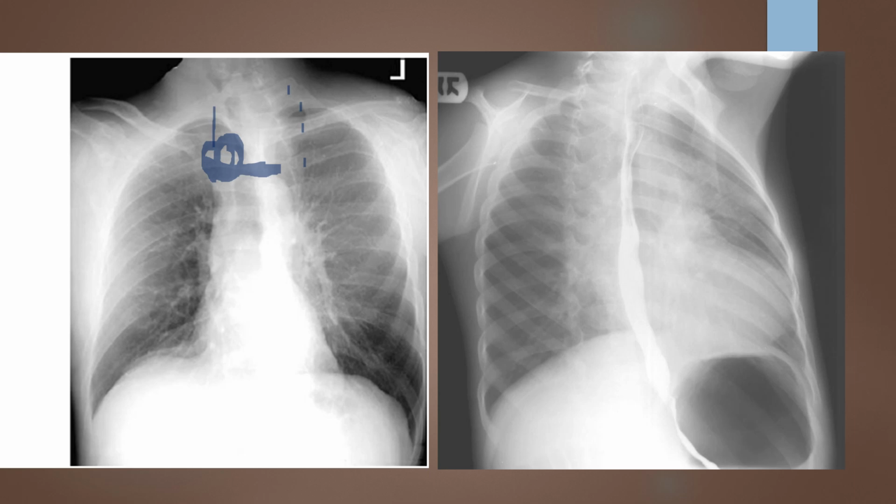Over here on this patient, just eyeballing it, it looks like they did a much better job. If this is not ribs, but it's truly an oblique chest, I see apex to costophrenic to apex, all the anatomy is there. That's checked off. Secondarily, now I'm going to go through my technique. So I'm looking for soft tissue detail, bony trabecular pattern, and good cortical outline.